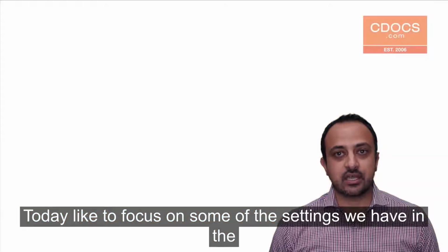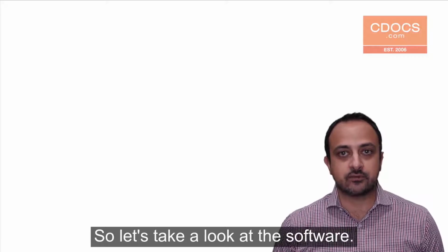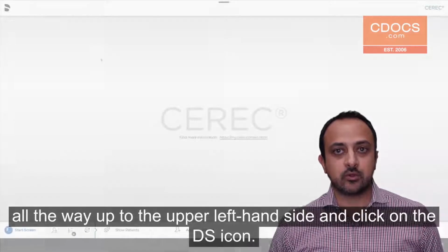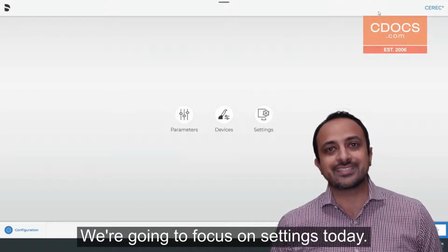Today I'd like to focus on some of the settings we have in the configuration menu of our CEREC software. So let's take a look at the software. We're going to go ahead and open up our main window. When you scroll all the way up to the upper left hand side and click on the DS icon, you'll see your configuration menu. We're going to focus on settings today.